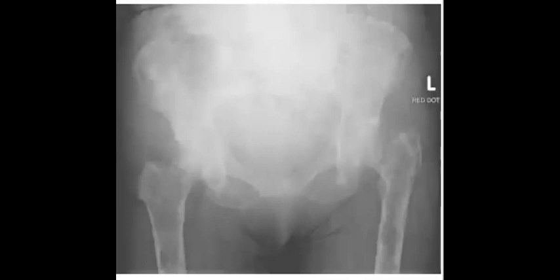I see. Yes, very nice. Multiple lytic lesions with endosteal scalloping with fractured left femur. Perfect. So multiple lucent lesions. This is the big title. You will start to search for the diagnosis or differential diagnosis. Multiple myeloma will be the top, and metastasis. So metastasis, multiple myeloma. If it is metastasis, it can be like this: multiple myeloma with endosteal scalloping. It is not specific, but you can see it. So yeah, multiple myeloma will be one of the good differentials.